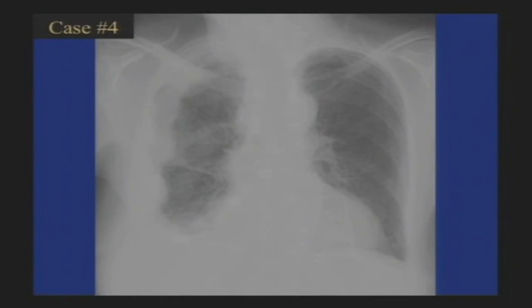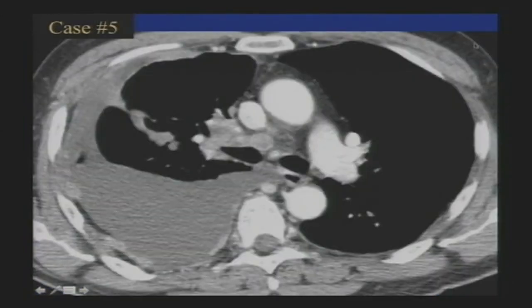Diagnosis, basically only two things this could potentially be. And then what underlying exposures would you imagine the patient had? And lastly, here's a pleural effusion. It's not your plain old nondescript pleural effusion. It has something associated with it, and that sign is fairly specific for one diagnosis.